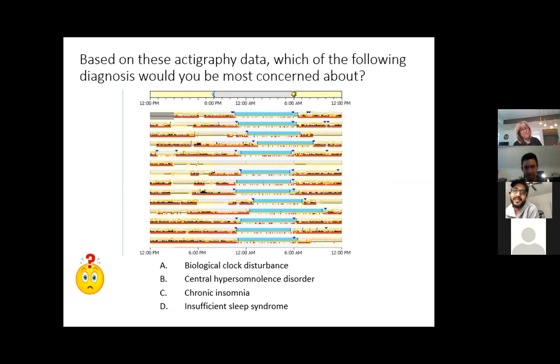Okay? Is everybody with me? Makes sense. Yes. Yeah, it makes sense. And maybe he's got a little sleep fragmentation, a lot of red dots, fragmentation with his narcolepsy. This is a good one for narcolepsy, and it actually was a real one. Okay.